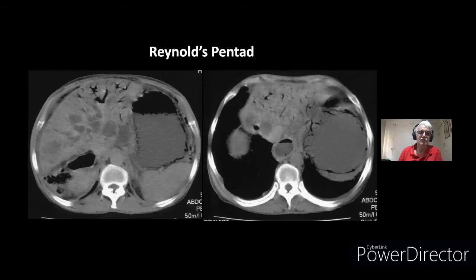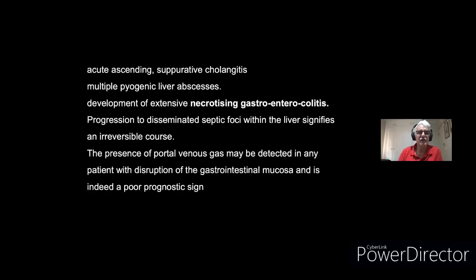And of course, the cause of it was 2 stones in her bile duct at postmortem. So it's very sad, and I hope you never have to see any radiographs like that. So she had acute ascending suppurative cholangitis, and I think these types of patients, we don't know if they exist in sub-Saharan Africa, but certainly the ERCP services are not as well developed as we have.